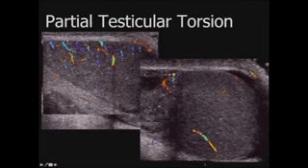But if you are relying on a sonographer, or you have in your mind that this is a binary decision of flow versus no flow, you are going to miss these cases. And they're not common, but they're not rare either. So you have to pay attention to the semi-quantitative amount of flow between the symptomatic and asymptomatic side. If the flow is less or even equal, you have to be worried about torsion in a painful testis.